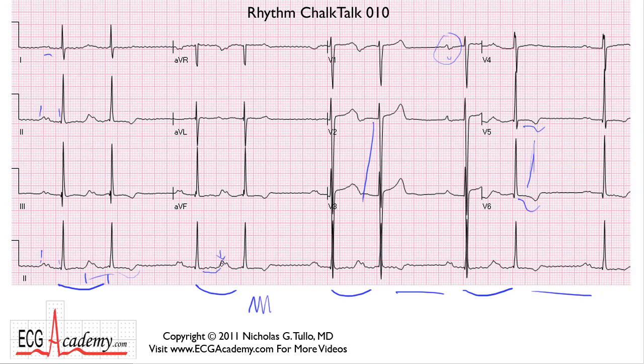So I would say this is the start of the P wave in this beat, and the PR clearly gets longer compared with this PR interval. Yes, you can take calipers if you don't trust me, but my eyes are looking at this and say this is almost 360 milliseconds, very long. So, okay, you got group beating, you've got pauses, you've got PRs that are getting longer. So, what do you think?